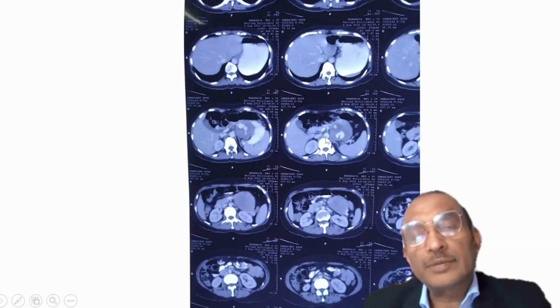And artery will always have a fat around it, whereas veins may or may not have fat. So this is the SMV, which always looks bigger compared to SMA, and SMA will run parallel to it. Because it is coming in multiple cuts, so this is SMA. So either you compare the enhancement pattern from the aorta or SMA, and you see that it is comparable. So this is some sort of arterial enhancement.